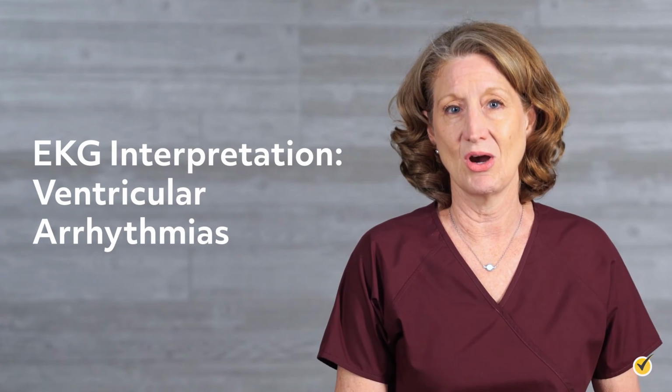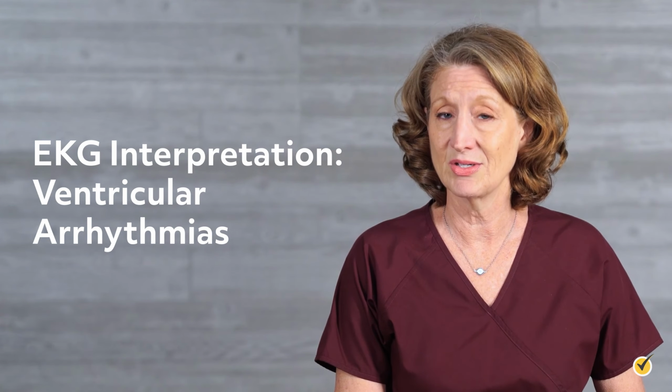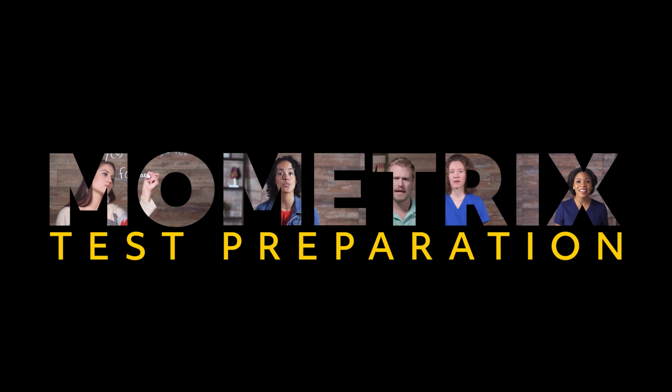Ventricular arrhythmias are abnormal heart rhythms that originate in the ventricles and are the leading cause of sudden cardiac death. In this video, you will learn about ventricular arrhythmias and how to identify them on an EKG strip. Let's look at a quick review of the heart's electrical conduction system to understand how ventricular arrhythmias occur.